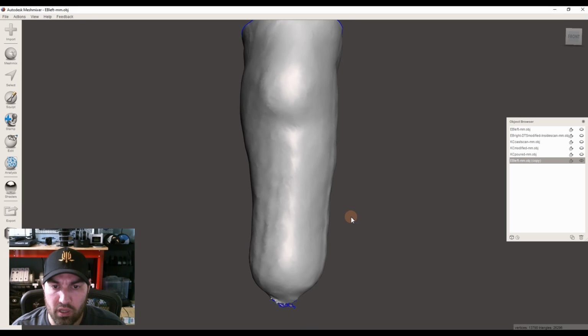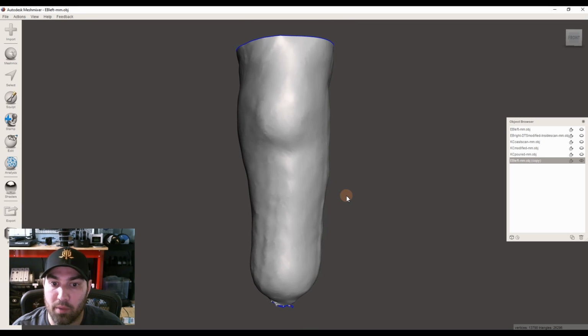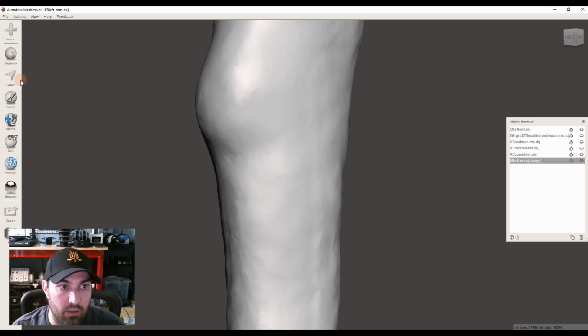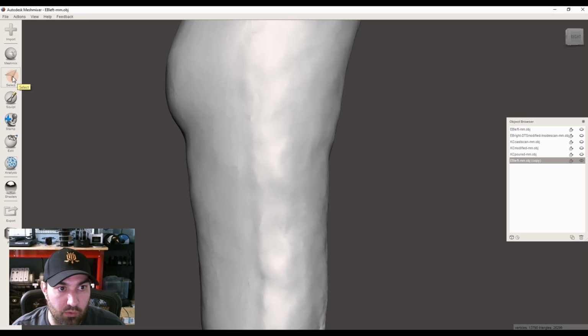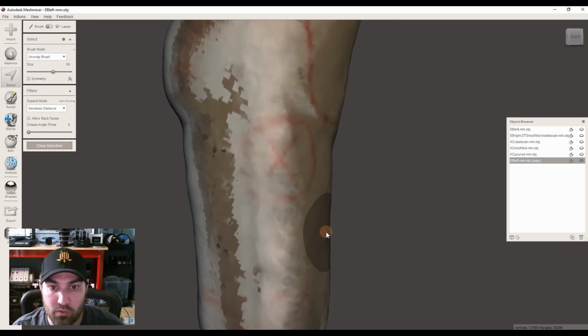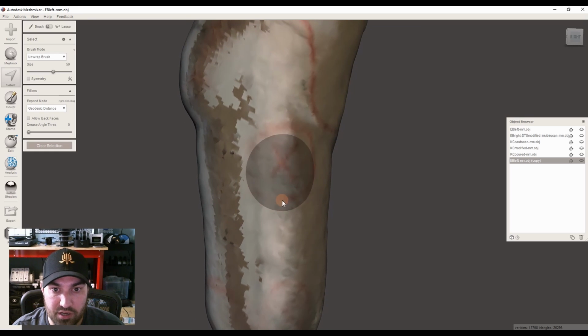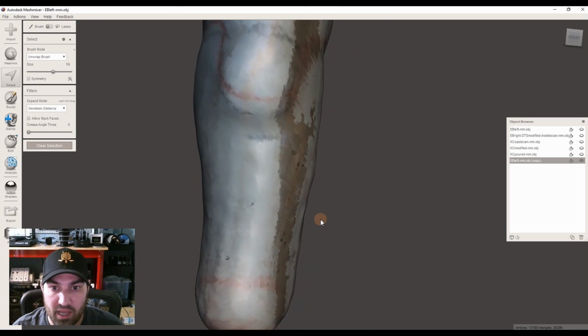And then if we start looking at things like buildups and reductions, talking about modifications, I'm going to show you first a few ways to do buildups. I'm going to go through 3 of them here. So let's flip back to our other view by hitting spacebar and changing that. And let's do a fibular head buildup.